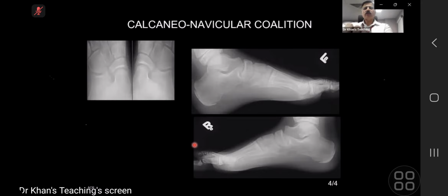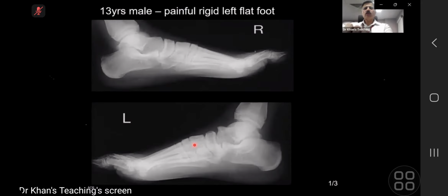So this was calcaneonavicular coalition. Well done. So still with you, candidate 16, this is again your case. So again, there is left anterior talar beaking. Excellent. Because you are doing coalition, you asked for AP film, you asked for oblique film, and there was nothing. What else will you ask then? We asked for the axial to look for subtalar. This is the axial.